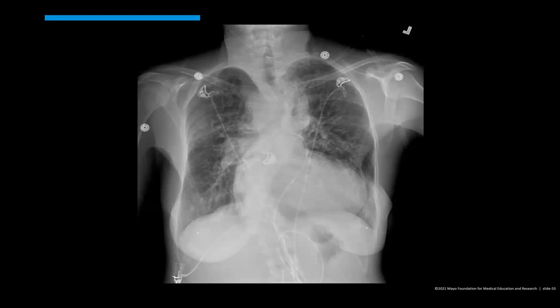We had one more question come in about the last case, whether it was showing regurgitation or stenosis at the valve. Good question. We'll go into that a little bit later; I have a couple other cases that will go over regurgitation and stenosis. In that particular case, I was only showing you a single image from systole.